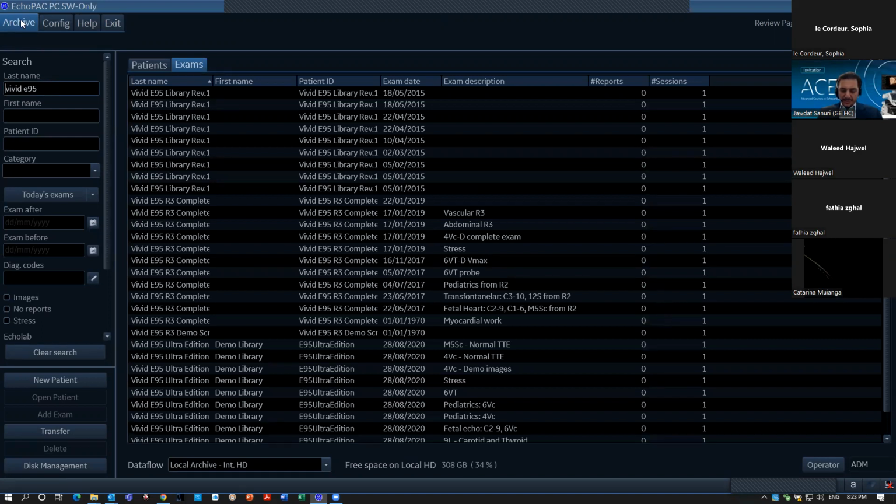overcomes the pressure load limitation of the strain, or changes of the strain resulting from pressure load. So if you have a patient that you do an AFI for, and the GLS value is, let's say, -14, or -12, which is close to borderline hypokinesia, and then after 2 months or 6 months or so, you do strain again, and you find the value is actually reduced, it's -10. However, the blood pressure went up from 120 over 80 to maybe 180 over 100. So the reduction in the strain value is normal when you take the blood pressure into consideration.